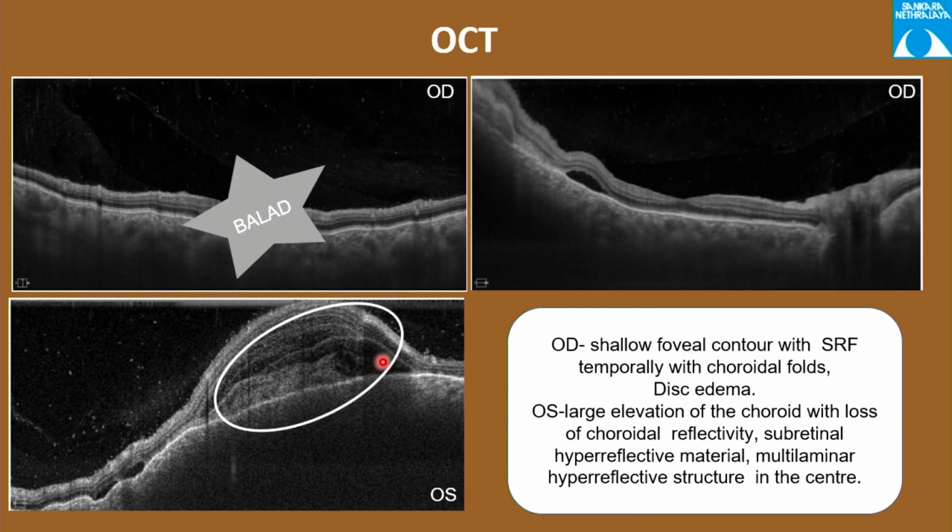And if you see the FFAs of a lymphoma, they will be silent FFAs. You will not have any findings, because that is an infiltrative pathology. It is not an inflammatory pathology. So that is what your differential is.